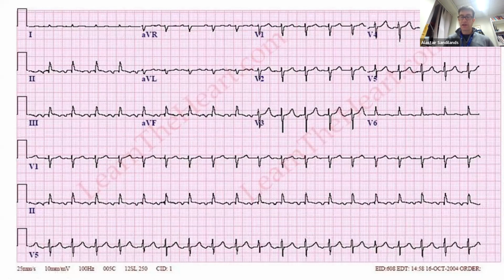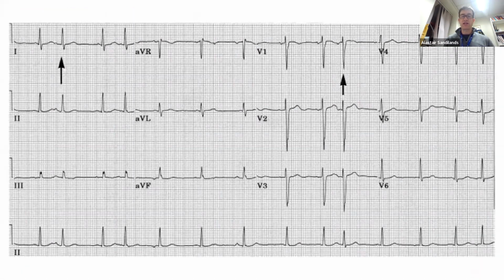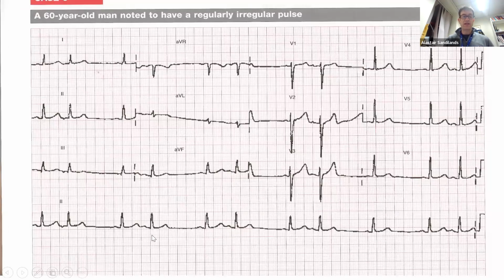Atrial tachycardia. So what I've tried to say is you've got an atrial ectopic here, which is just one beat occurring on its own, atrial ectopic.